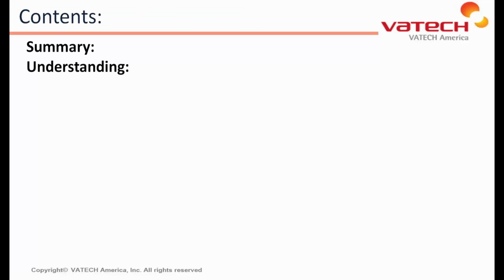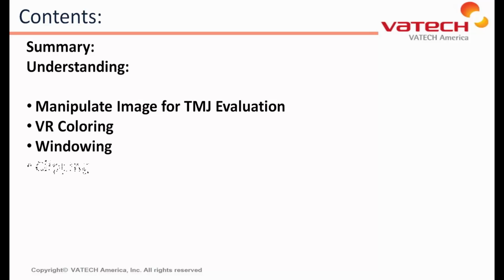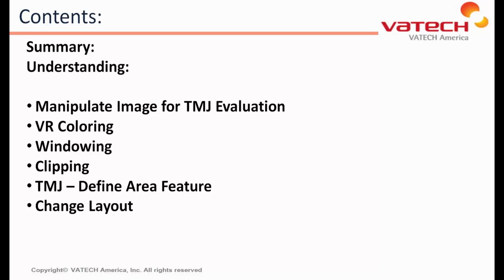our view. In summary, you should now be able to manipulate images for TMJ evaluation, apply VR coloring, understand windowing, clipping, TMJ define area feature, change layout, as well as default toolbar.